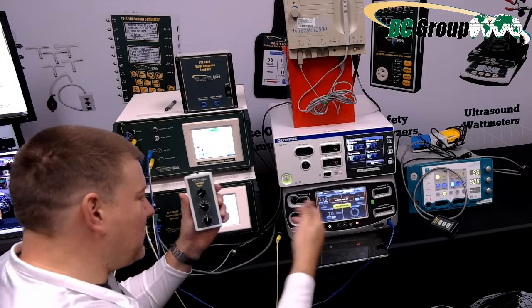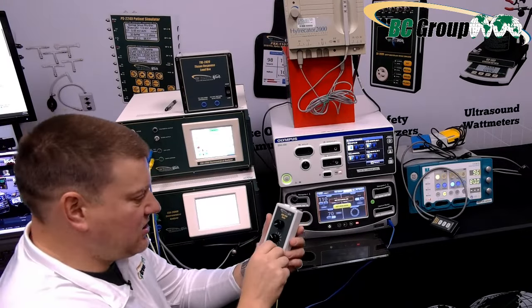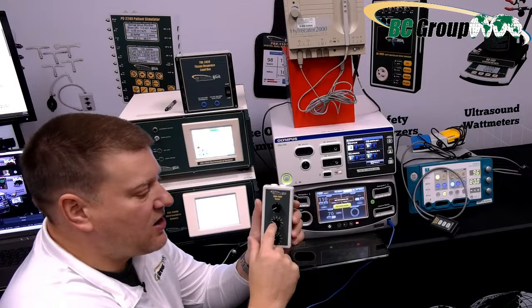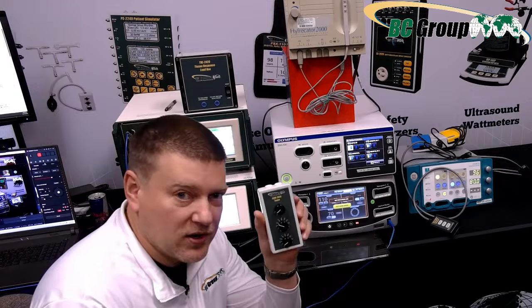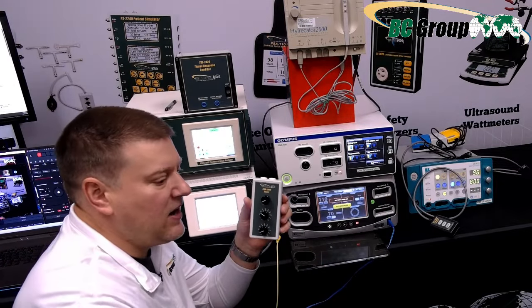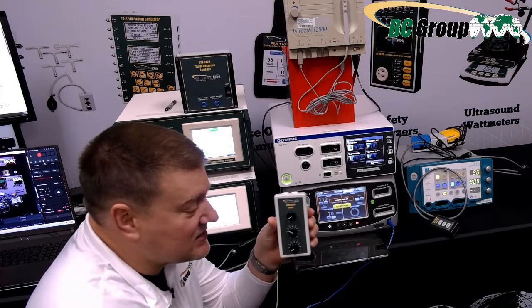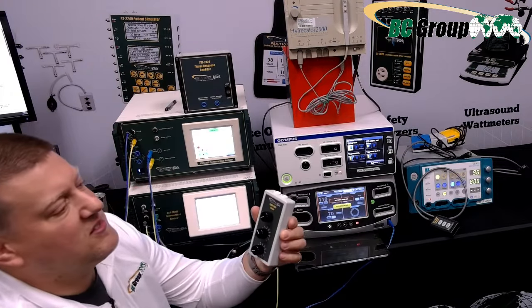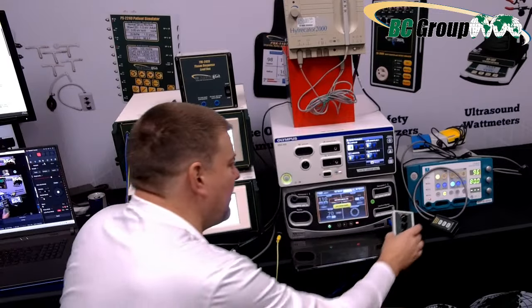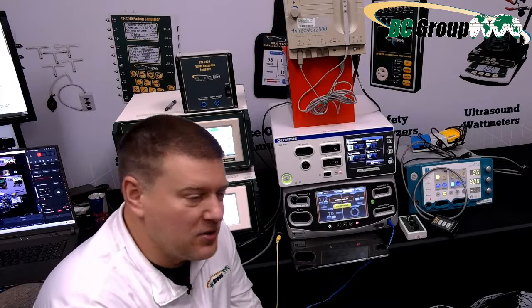Is it green? Is it red? 136. Now it's red. It's a passing condition. So red at 131. Large dials with pointers indicating where you're currently at. So easy to read. And there are no mistakes of activating other switches that you didn't intend to activate, like some decade boxes out there. This guy, check it out. This is the CQM 2000 tester. Guys, I love this thing. Absolutely love it. Wish I had it back when I was out there pounding out some ESU PMs.